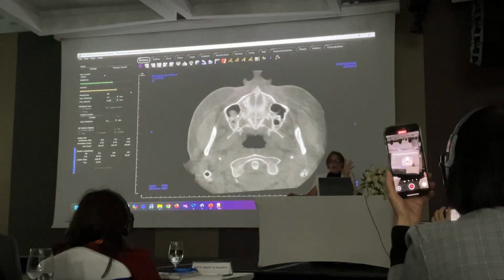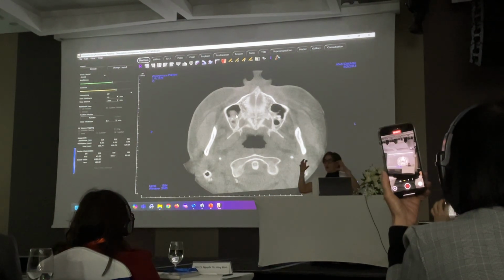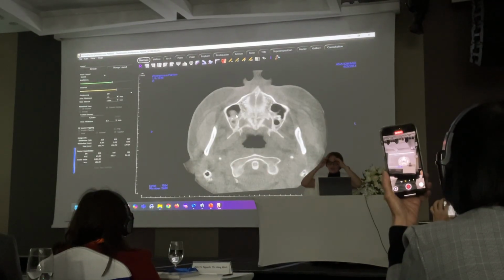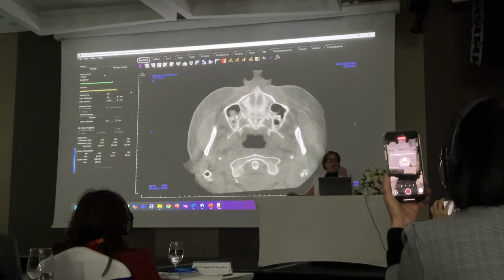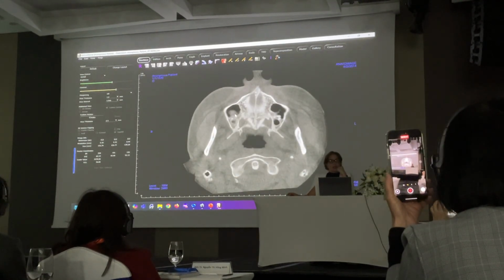The most common thing you're going to see is going to be sinusitis, sinus inflammation, okay? Sinus inflammation tends to be generalized, meaning that you're going to have something gray on both sides and in many sinuses, okay? If you see something gray like this on only one side, there is a list of differential diagnoses.